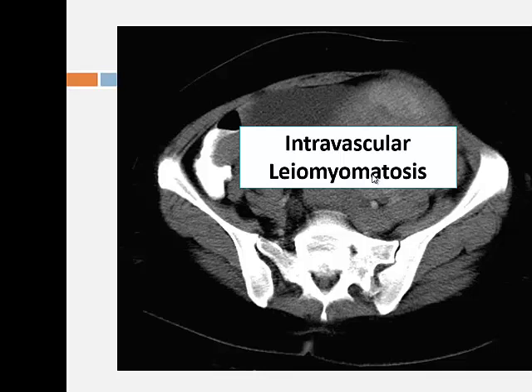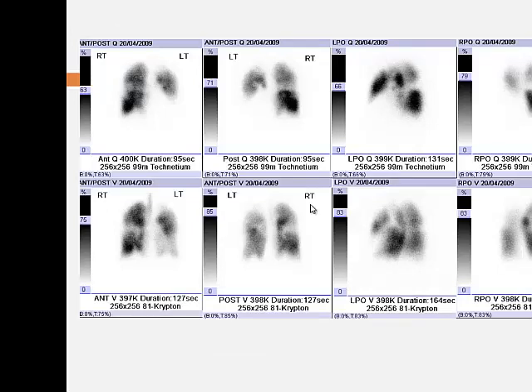Especially, obviously, if it's a woman, you wouldn't necessarily venture it if they're a bloke unless they went to transgender reassignment. Okay, next case. Okay, based on that VQ, would you say low probability, high probability, intermediate probability?